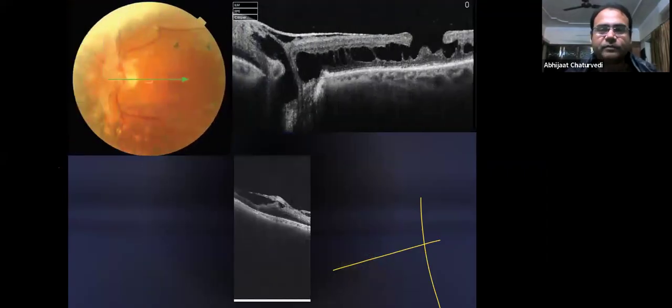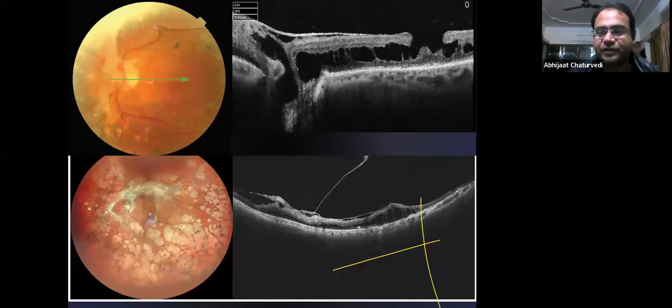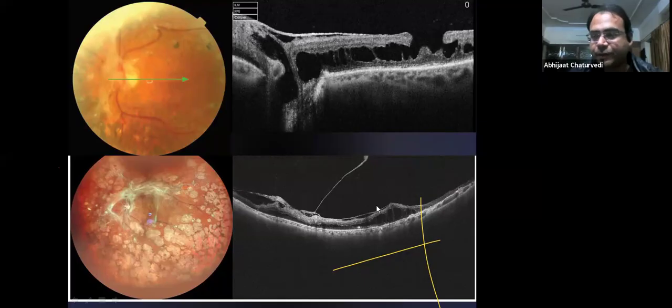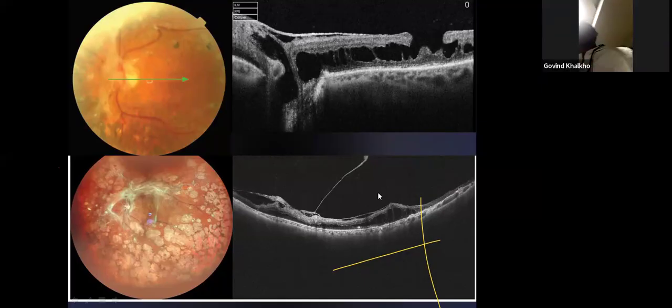So after such cases, you also have these type of cases in your OPDs, which are very bad. Now, when you do an OCT through these two, again, they show very varied pathology. But when you do a clinical photography or the fundus photography, there is some difference, but not a huge difference that involves your central part of the retina or the macular region. Now, this patient will somewhat have better vision as compared to this patient. Okay. And why is it?